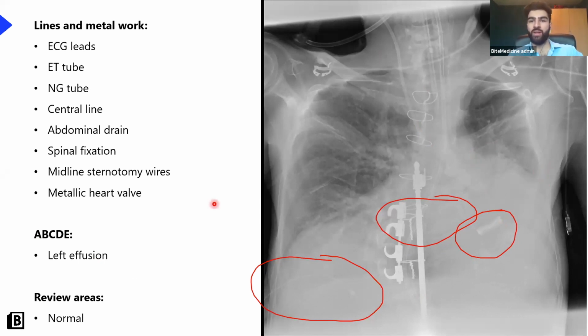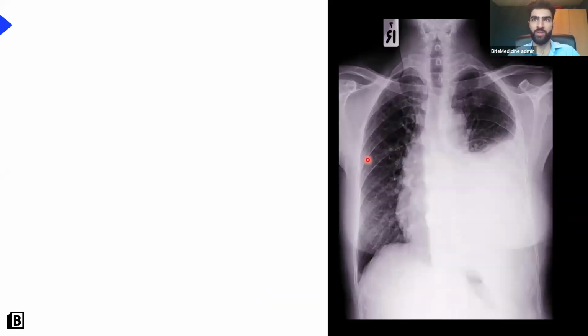So my point is that you'll never get something this difficult in your exam, but when you are all doctors or physicians associates one day on the ward, these are the sort of cases you'll be looking at, and you may find it difficult, but don't worry, use the systematic approach, and you will nail everything. Okay, let's crack on. So what's the diagnosis?